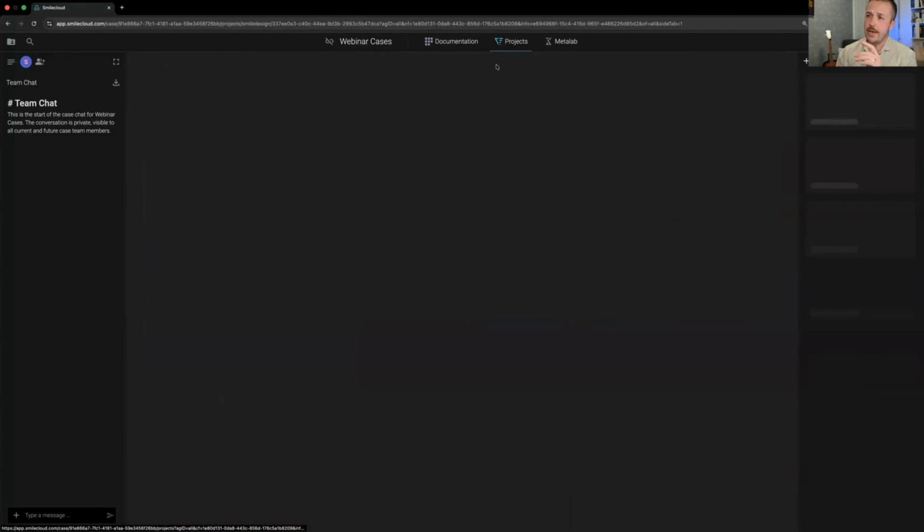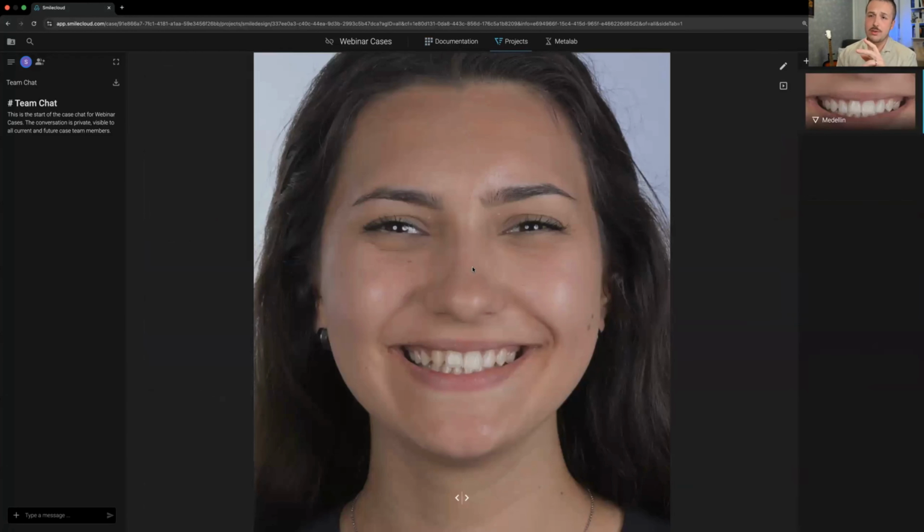In the second case of the day, we want to achieve a bit deeper planning. So this 2D designing is basically just presenting something we can do. You can show something which realistically might not be possible at all. So this is something which you need to be careful with.